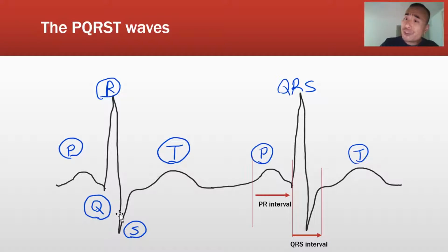So it is understood that the atria relaxes inside the QRS: the atria contracts in the P wave, and then it needs to relax, but because the ventricles contract at the same time, it doesn't show, since the QRS from the ventricle is so much stronger that it completely overshadows it.